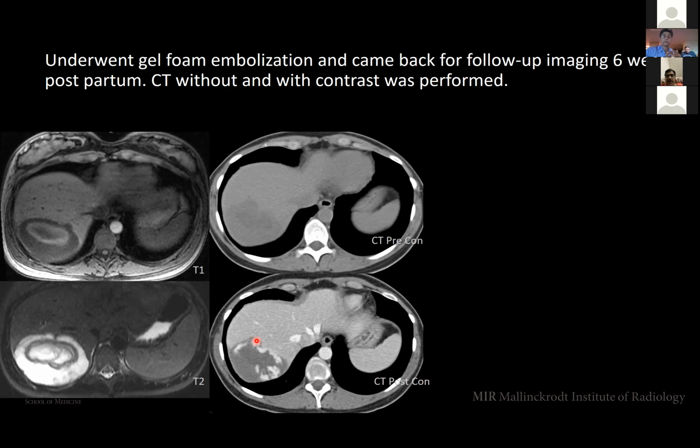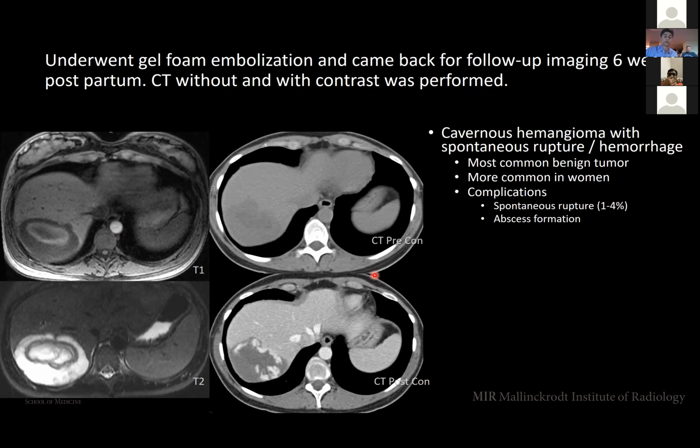I want to emphasize this particularly with hemangiomas. Hemangiomas are the most common benign lesions that we encounter. But at the same time, hemangioma is also the most commonly misdiagnosed lesion that we encounter, when we fail to recognize the various patterns or atypical nature of hemangioma. So our role as radiologists does not stop at saying, yes, there is a large lesion in the liver. We are doing a disservice, particularly with an MR, unless we go into specific characterization and characterize this with certainty as much as possible.